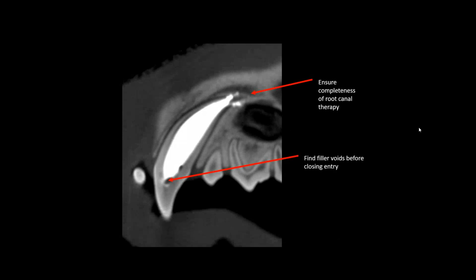You can decide whether it's normal or not by habit once you've seen it a few times, or if you have any doubt, you can also clearly and easily identify the cemento-enamel junction, the CEJ, which is very obvious on this particular image, and then take a measurement of the distance between the CEJ and the crestal bone. If this measurement is within normal limits, then you know that this is normal bone level.